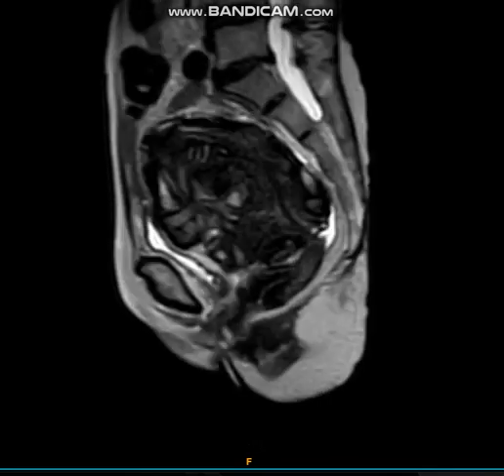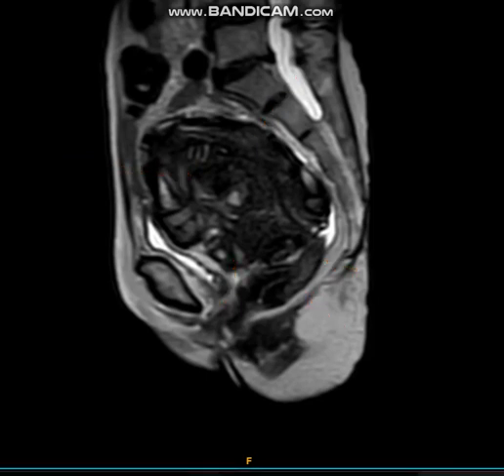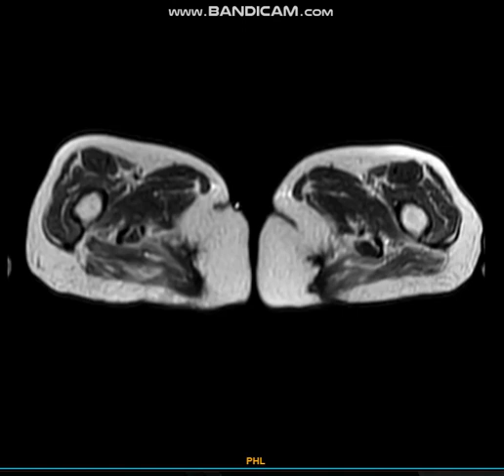the uterine wall. This is the uterine wall, which is displaced posteriorly. And this is a fetal calcified mass that is seen in the abdomen. And we go to look at the axial sections.